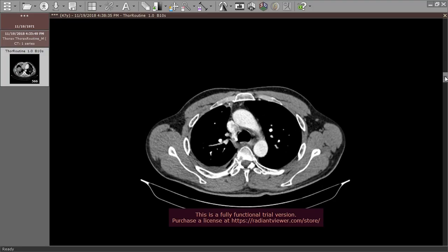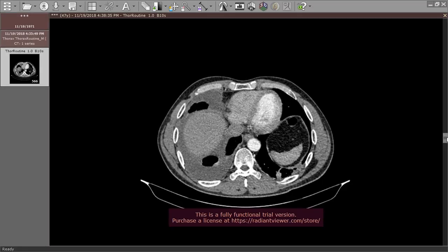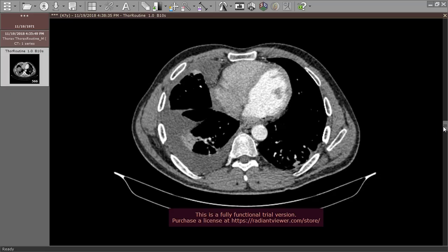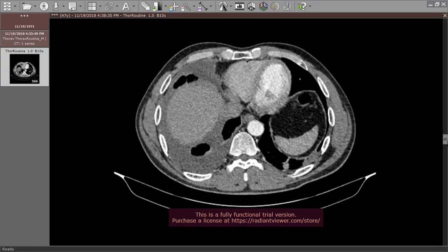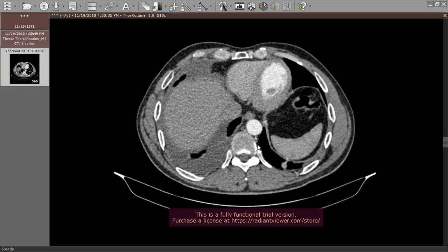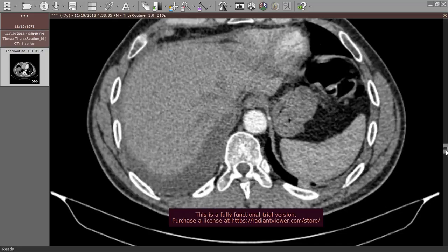Case number 1. Simple. Just to demonstrate for you the pleural effusion, a simple pleural collection. On the right side here, we have no soft tissue thickening, we have smooth outlines. We have clear extrapleural fat planes, no extrapleural nodes.